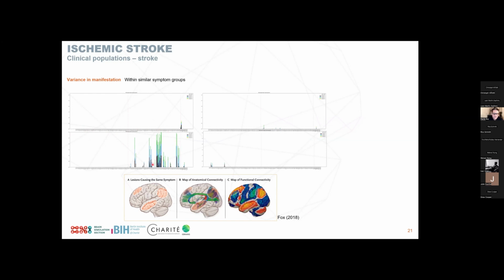And we see in black at time point 1 the actual impact on a specific region. Right? So if the black bar here is very high, it's 1, which means that this region is entirely encapsulated by the lesion itself. Right? So it's fully engulfed in the lesion. And we see already just the sheer number of regions that are affected differs significantly.